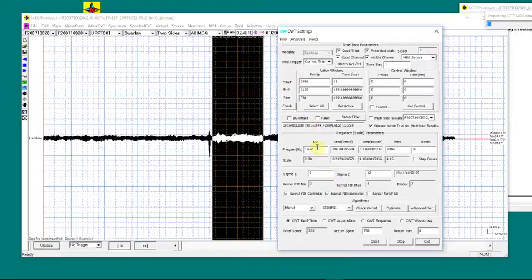And I will analyze from 20 to 1000. And for the frequency bands or frequency bins, I want 600. Because this is functional data, so I will use a real time. So other parameters, we do not have to make any change at all. The algorithm is the default. It's real time. Once we click start, we will start to compute the data.